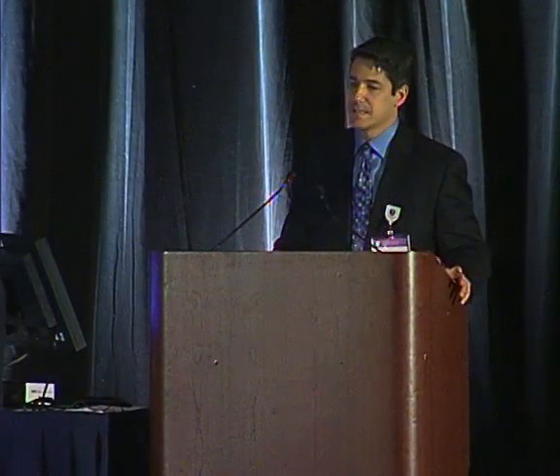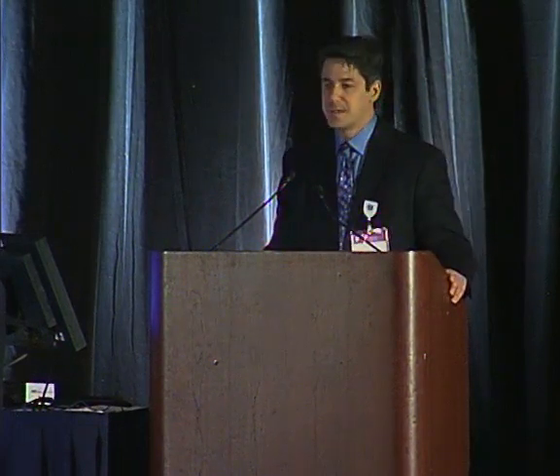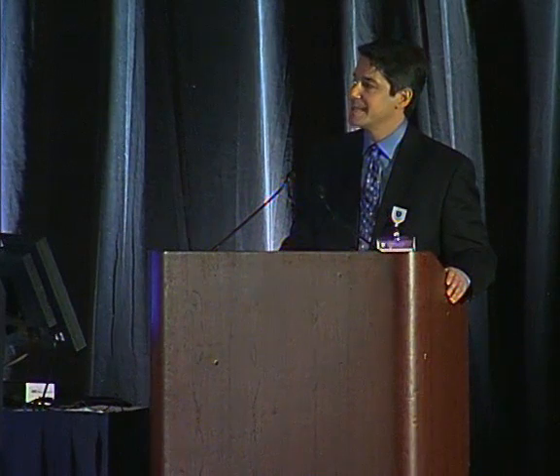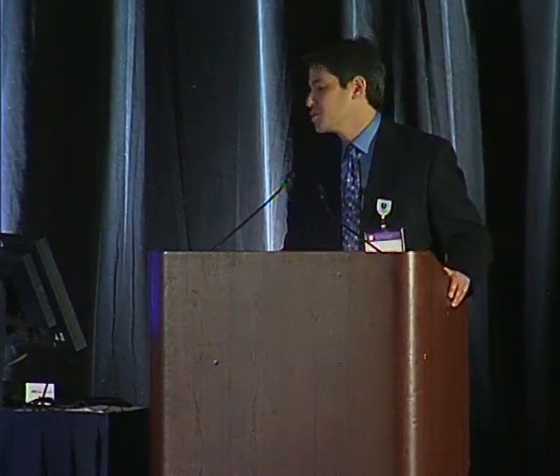What's the significance of this structure? Well, this is what helps tether the distal biceps tendon in place. So if you have a very distal biceps tendon injury, but this is intact, it won't retract too far up into the arm. So it's important to tell the surgeon about that.